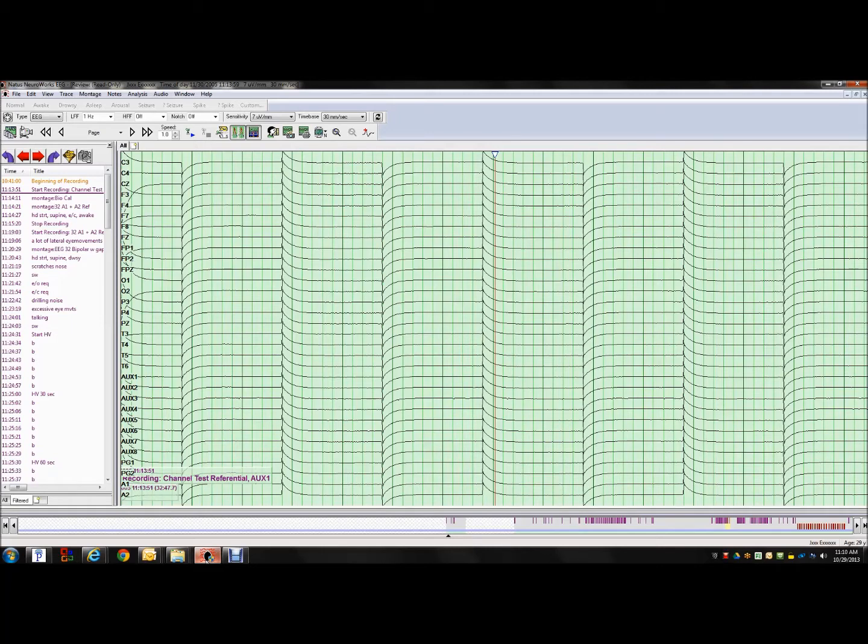So this is EEG review 2, EOL234. You can expect the same format as in part 1, where I will review an EEG every week and you will report an EEG every week. And as you know, each week we have a certain topic. This week our topic is artifacts.